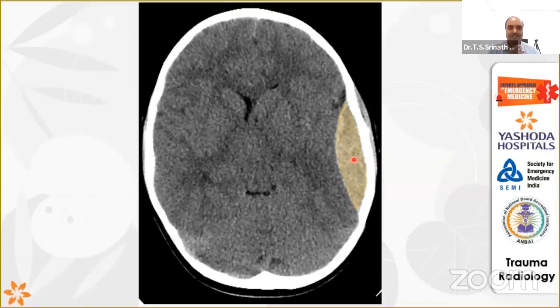What else does this patient have? Rightly written here, there is also a midline shift. So always please calculate the midline shift. How much is the midline shift? Make an arbitrary line and see how much the shift is.